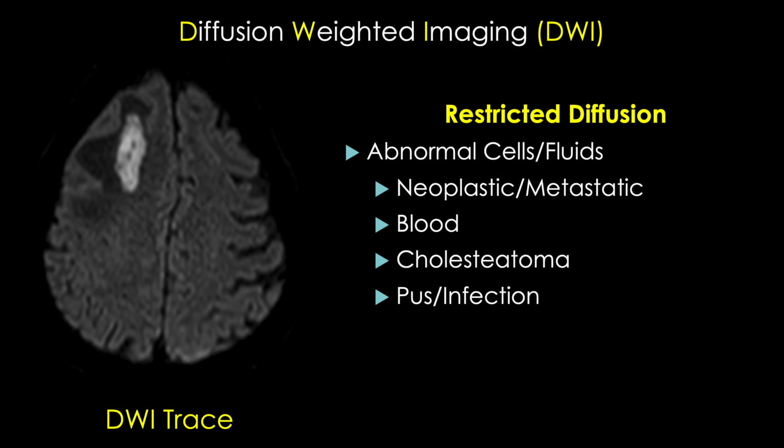So this is not an exhaustive list. There are many other things that show restricted diffusion, like epidermoids, but I think it's a good start.